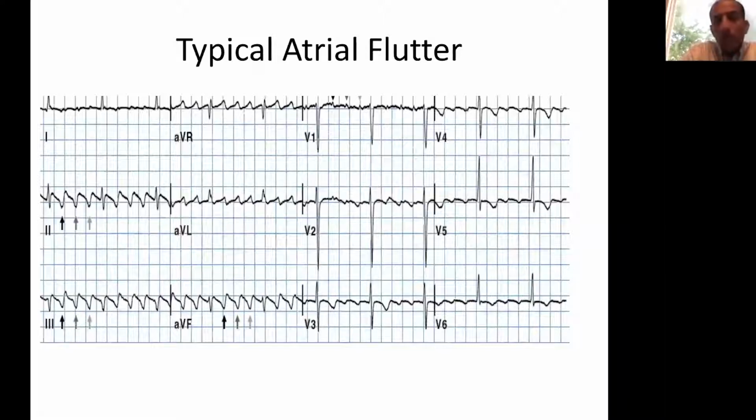Now, the other causes of supraventricular tachycardia, which are not necessarily regular, are atrial flutter and atrial fibrillation. Atrial flutter, everybody should be able to pick up on the ECG, and this is a classic 12-lead ECG of atrial flutter. What you see are these P waves, which have a sawtooth pattern. You will see a lot more P waves, much faster. P waves are going at 300 beats a minute. Usually if these patients are not on any medications, the QRS goes at half the rate of the P waves. This patient is not doing that because he's probably on medications.